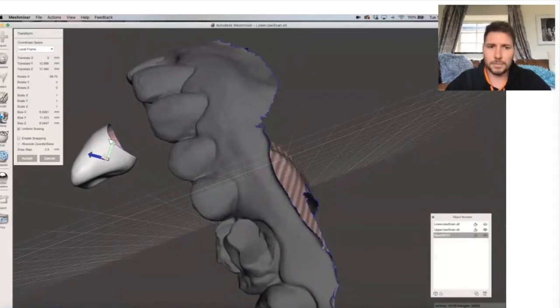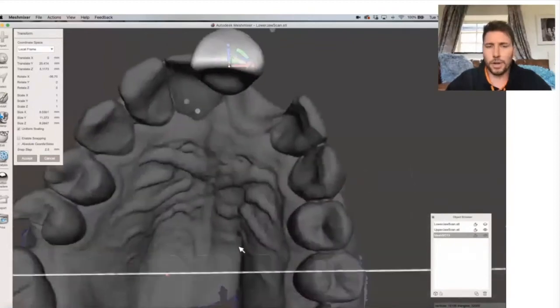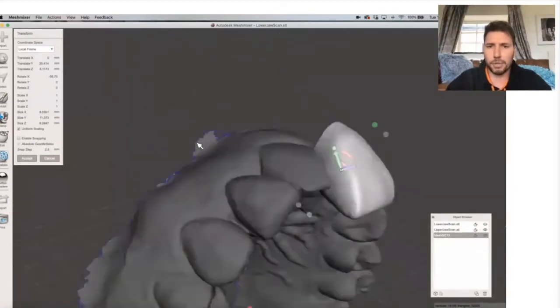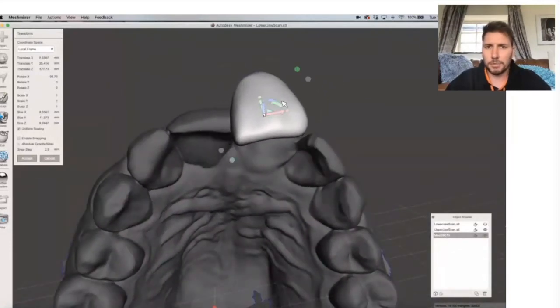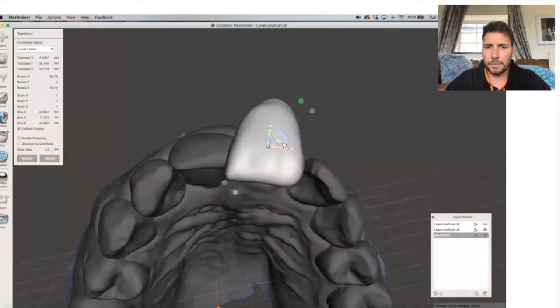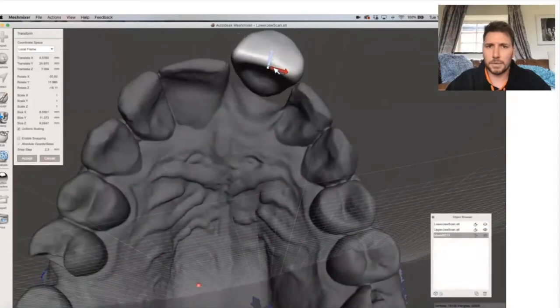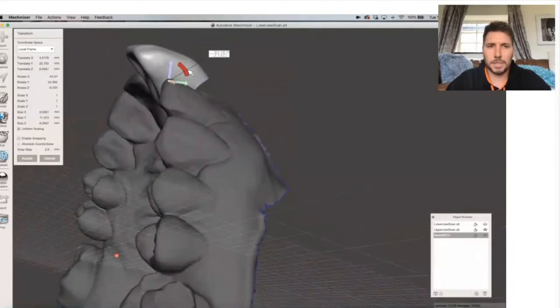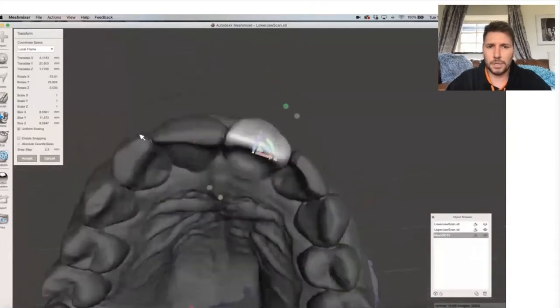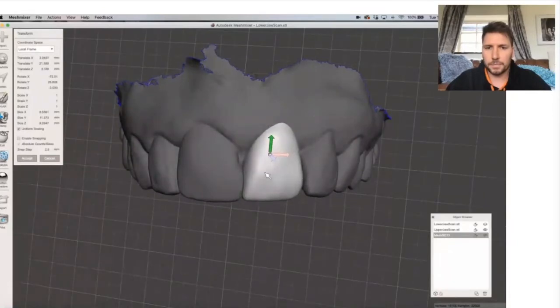So I'm going to move this. Move it up here. And then we're still moving the whole frame, exactly like I said before. Right click and rotate. Middle click on the scroll wheel to move it around. I'm going to rotate that there. There you go. And that one, so it's up there. Okay. So we've sort of got that in the right place.